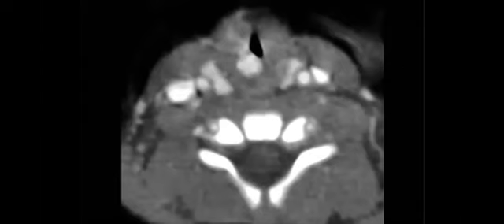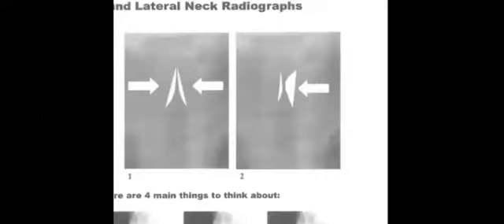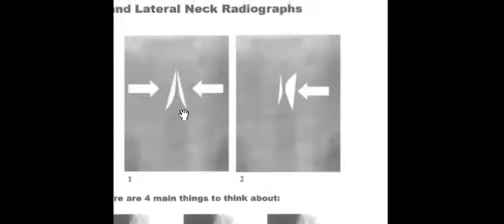So I want to show you something very quickly because now it's easier to know. So when you find this one, this is the difference between hemangioma and croup, okay? The croup here is easy, you can see the steeple sign, but when it's asymmetrical in one side, then it is more likely a mass or infection and so on, okay? Is it easy now?